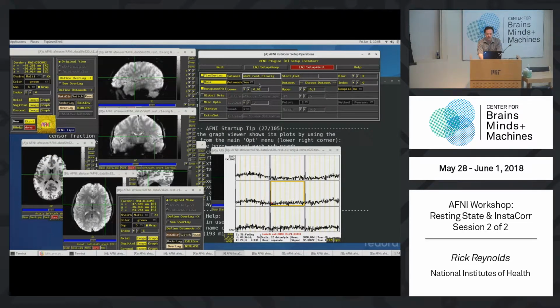Let's just rip through some of the processing steps. Let's remove, I don't know, 3 time points at the beginning. I don't even know what the TR is, but we don't have to worry about that. Let's apply perhaps a 5 millimeter blur to the data. We can auto mask it. That's great. Fine, we'll do band passing since it's set on by default, even though I'll cry about it a little bit. Despiking takes time. Let's not despike.